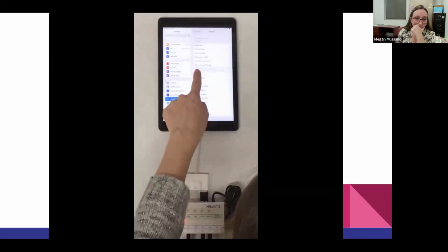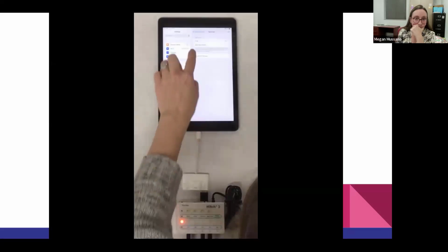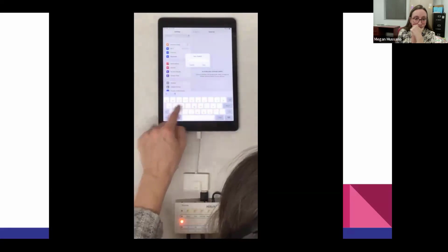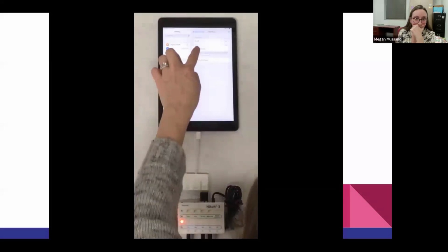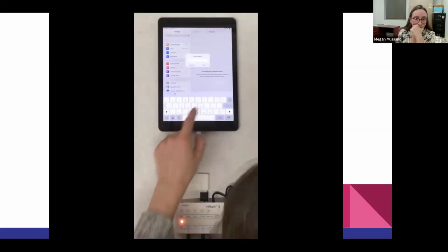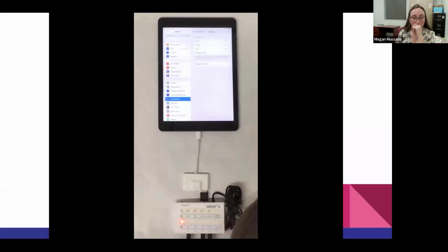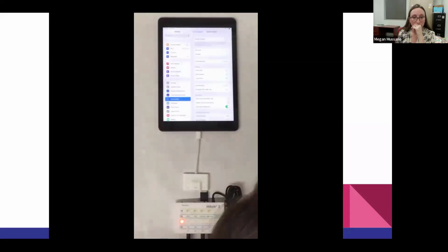You must select something under System, select Tap, and continue the process. Repeat the process for the other two switches. Add a new switch, external, activate. I'm going to activate orange left right there. And save. Press Tap again and add a new switch, and I'm going to do orange right arrow. So external, activate your switch and name it orange right. Click Tap again. Once you have all your switches added, you can then back out of the switches and we are going to create a recipe.